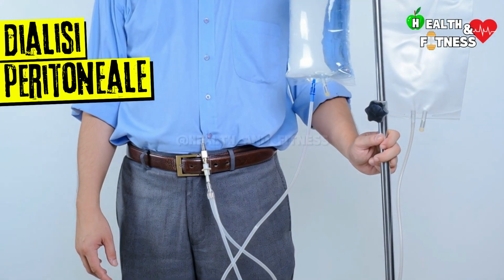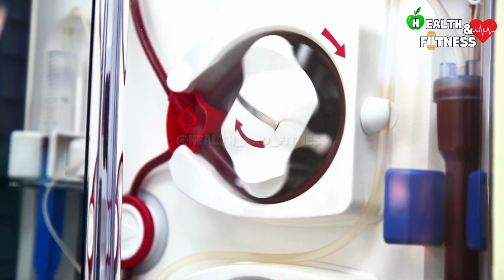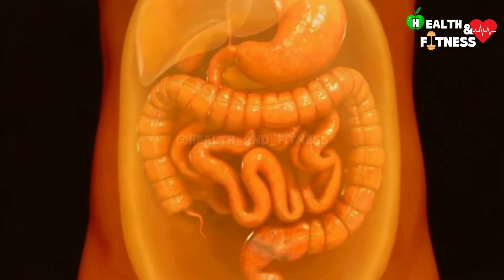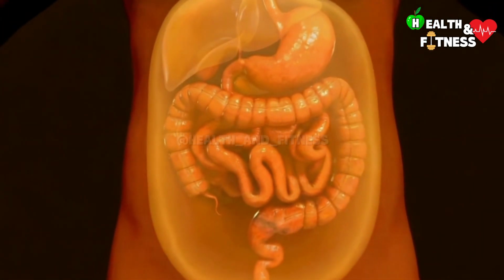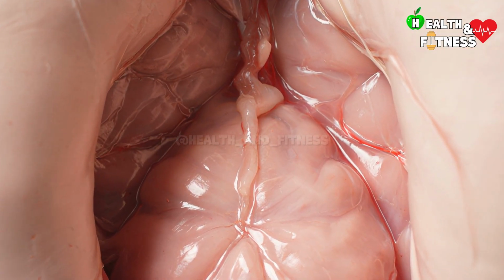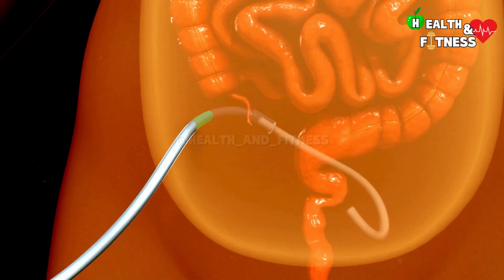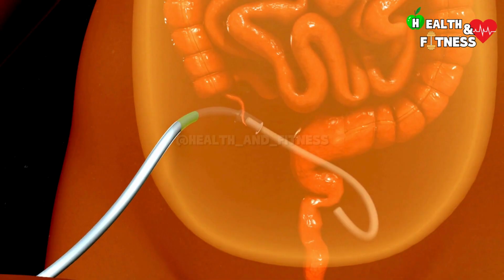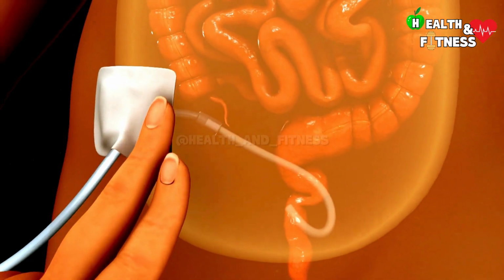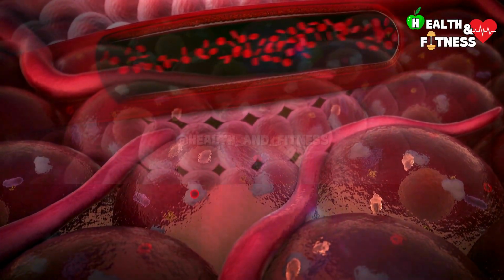In peritoneal dialysis, the purification principle is similar, but instead of using an artificial membrane, the peritoneum is used. The peritoneum is a thin, transparent serous membrane that lines the inner walls of the abdominal and pelvic cavities and covers most of the organs within them. In peritoneal dialysis, the dialysis fluid is infused into the peritoneal cavity through a catheter. An exchange of solutes then takes place between the blood flowing through the peritoneal capillaries and the dialysis fluid inside the cavity.